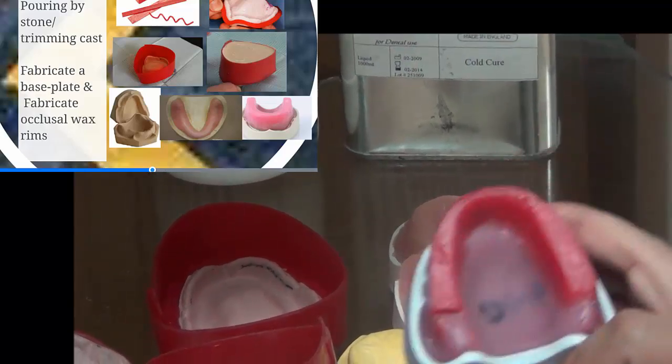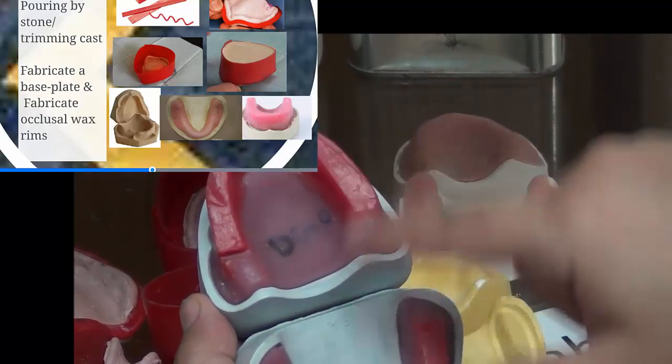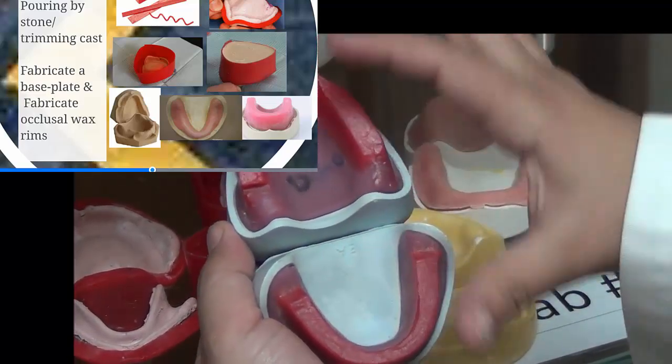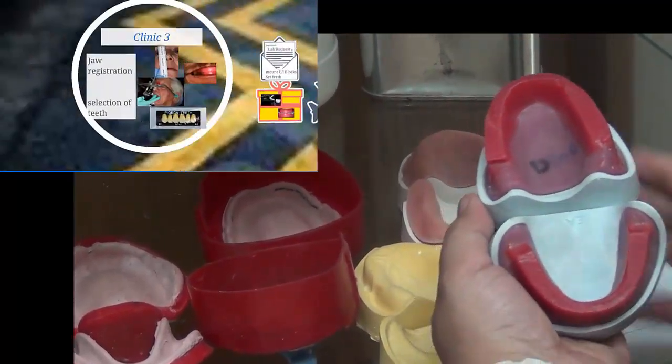So this part is made out of acrylic, and this part is made out of wax. So that's why we call them record blocks. This is called the base plate, this is the wax rim, and all together they are called record blocks. These are the result of lab 2. These go to the clinic.